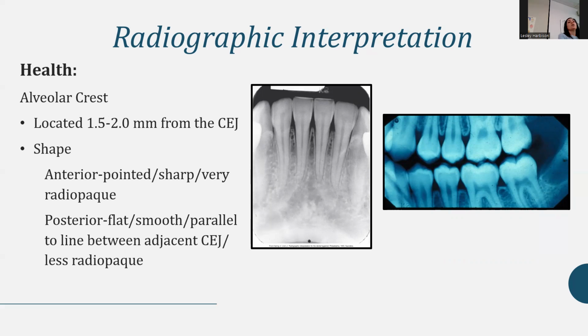So again, nice bite wings tend to be a really good measurement for this. I've tried this several times in lab, and it doesn't work because it's not calibrated.